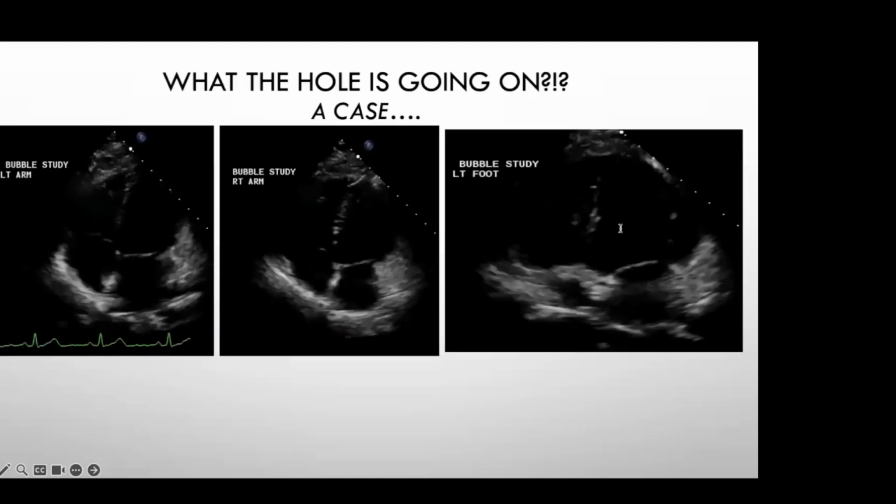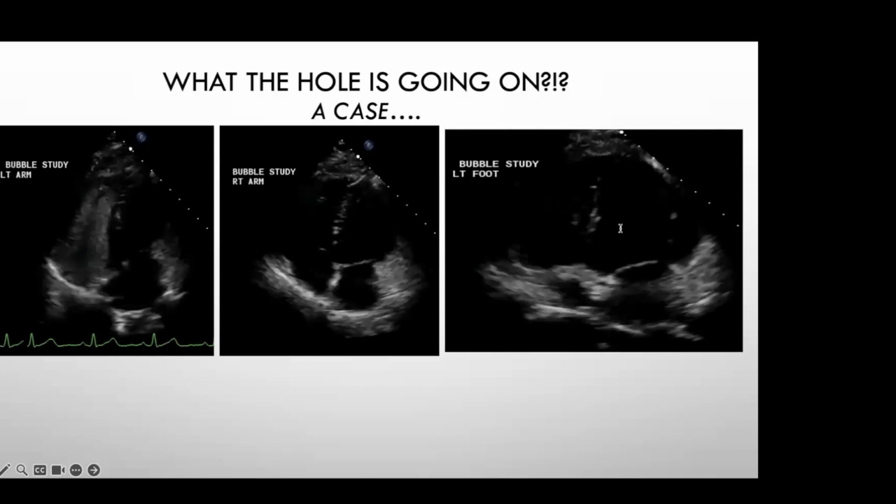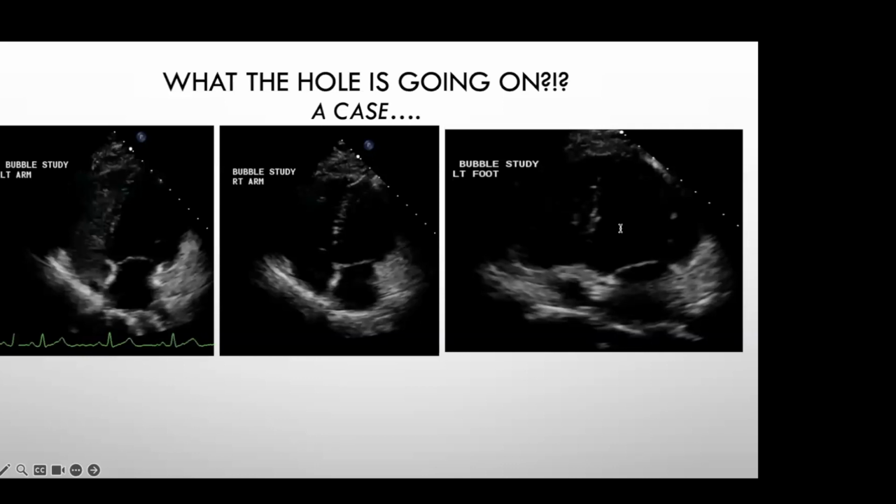So here we have 3 different bubble studies that were done on the same patient. This first picture is actually the picture that I was showing before, which was done through the left arm. And so that one is negative.